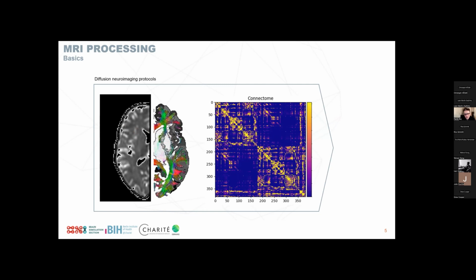And what this allows us to do then is to create these estimates of tracks that we have. And once we combine those with the already existing parcellation, we can then say, okay, for each of those regions, how connected is region 1 here with region 2, 3, 4? And we can create our structural connectome from this, right? So that we get a good estimate of the strength of the connection between these regions. And generally, we also get a good estimate of the distance between regions.